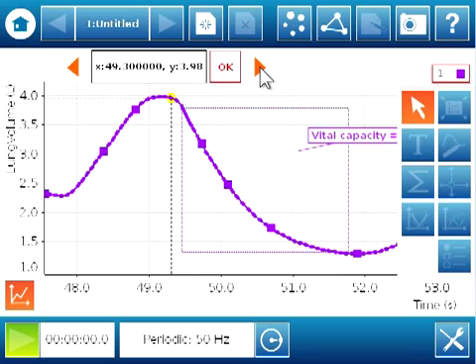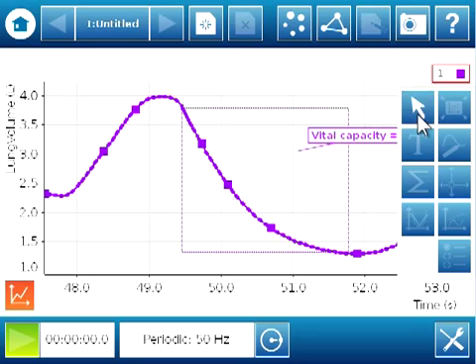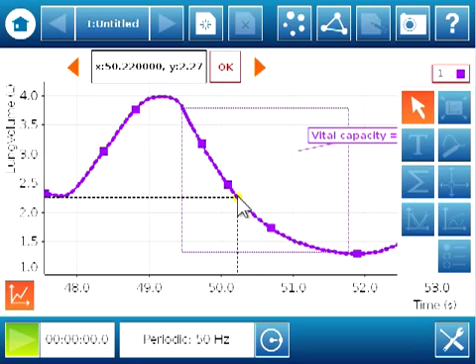I want to see the change in volume for the first second of exhaling. So I'm going to turn off my selection tool and then select just after 50 seconds. So again, I want 50.3, so it matches the first data point of 49.3. It's just 1 second later. So again, I toggled back and forth just using the right and left arrows, and I can see that the lung volume here now is 2.16. Comparing this lung volume to the lung volume 1 second prior of 3.98 liters, I can see a change in lung volume was 1.82 in that first second of exhalation.